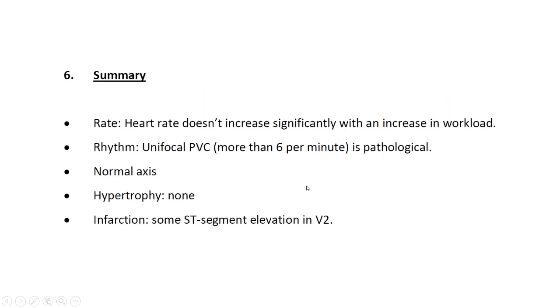So it's also good to provide a summary. In terms of rate, it was sinus tachycardia, because the person's resting heart rate was 101 beats per minute. Also, you have to identify how heart rate increased or decreased during the test. We've observed a very slight increase in heart rate, so heart rate didn't significantly increase with an increase in workload, which is worrisome.